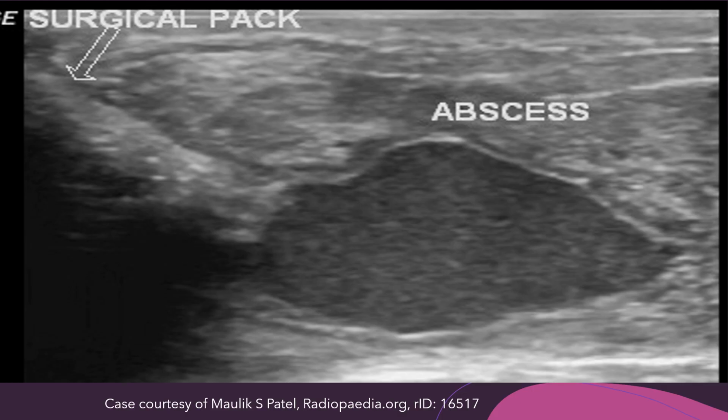So as discussed previously, this is a classic breast abscess. So you can see there is a hypoechoic center, and then there is a bright rim, which you would call a hyperechoic vascular rim outside. Also to be noted is there are these hyperechoic dots or loculations inside. And the Doppler is not shown, but if you try to do a Doppler, you would not see any flow.